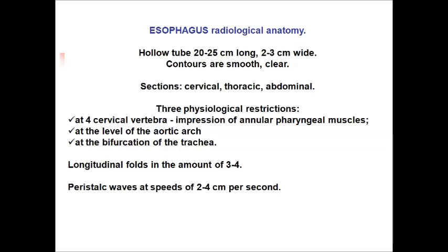It's normal, and you also will observe peristaltic waves of the esophagus at speeds of 2 up to 4 centimeters per second.